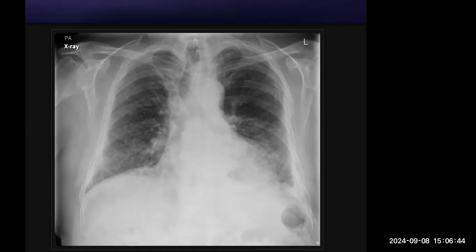So I'm suspicious there might be some nodule or lesion here. Can you ask for control and show me? Yes, okay, go ahead. So I think that there is a retrocardiac nodule seen here. Click once. Okay. There's a retrocardiac density seen in the left para-aortic region. This could represent a suspicious lesion.